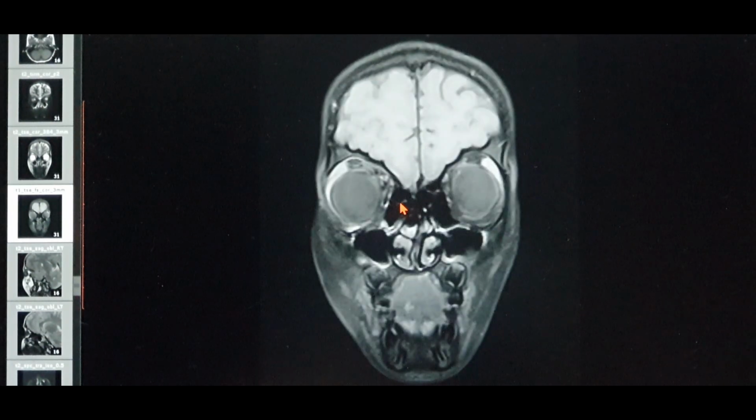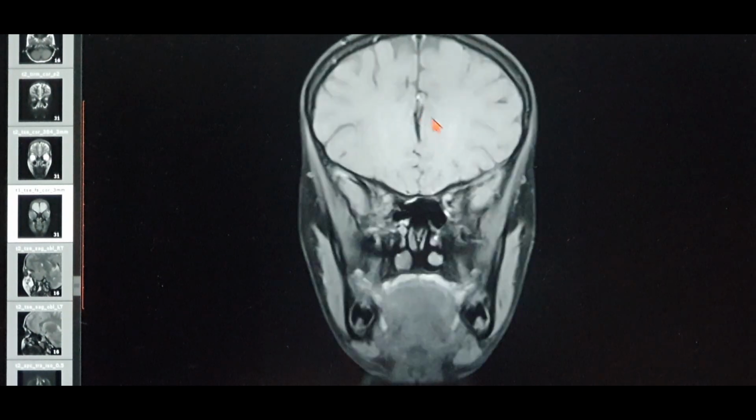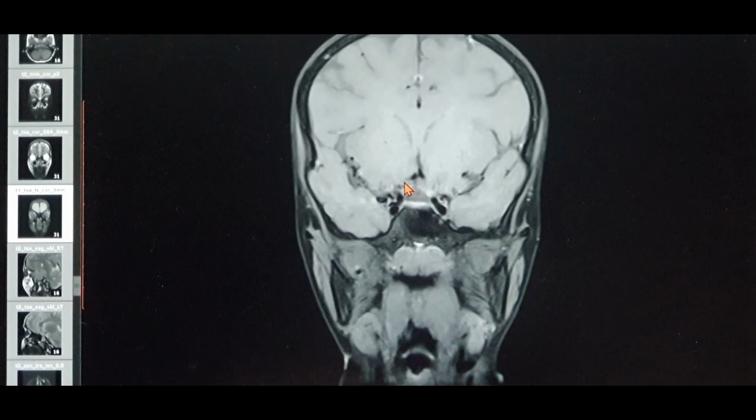It's a T1 scan. Now sometimes you also get a T1 scan post contrast, where you use a gadolinium contrast in the patient. In those cases, you can see the blood vessels in the brain flaring up. So you can see here the brain parenchyma. You can actually localize the sulci and the gyri, the gray matter and the white matter in the brain. So always look for the CSF as well.